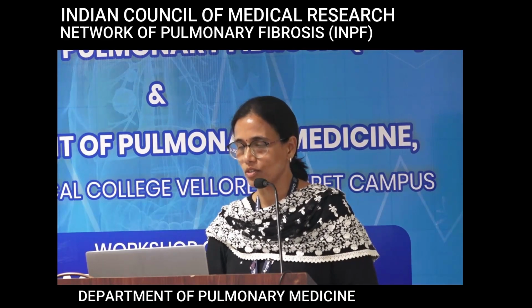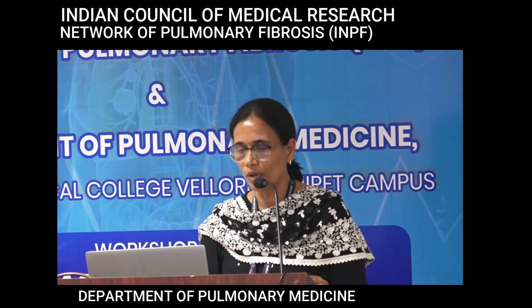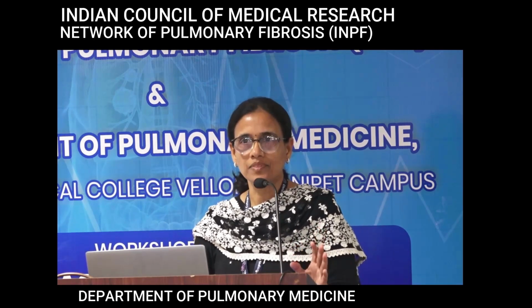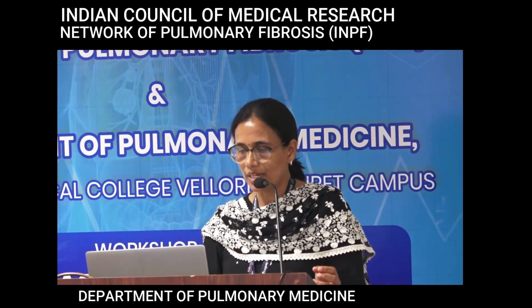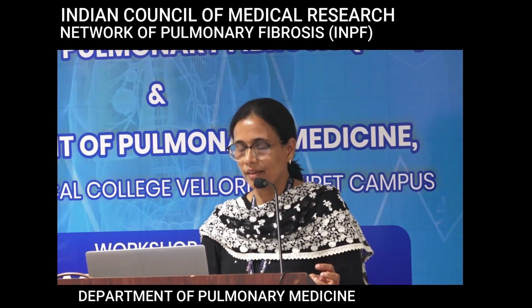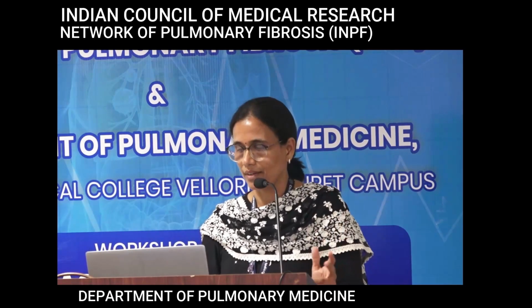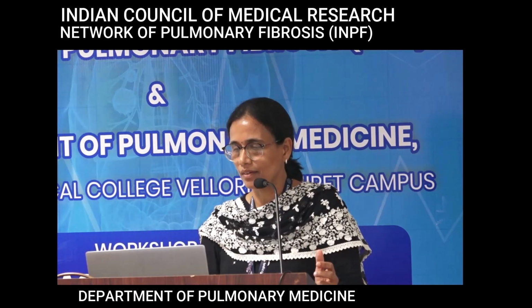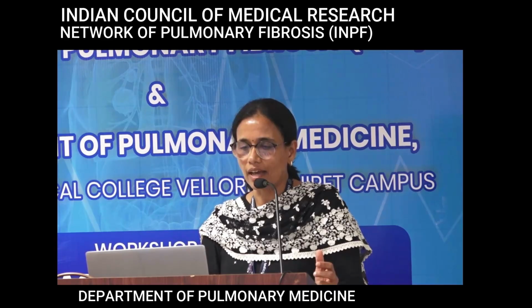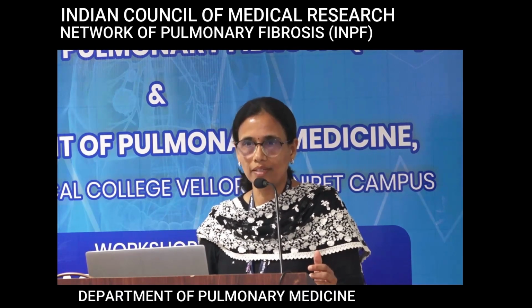And this four corners or anterior upper lobe involvement, small areas of fibrosis and honeycombing in the anterior upper lobe. All these are supposed to be more common in CTD ILDs. So this was a patient, she was 45 years old. Young age lady. All this also will bring up our antenna for CTD, and we saw this very excessive honeycombing, almost like a straight edge, and these islands of fibrosis anteriorly in the upper lobe. So we thought this could be a CTD ILD.